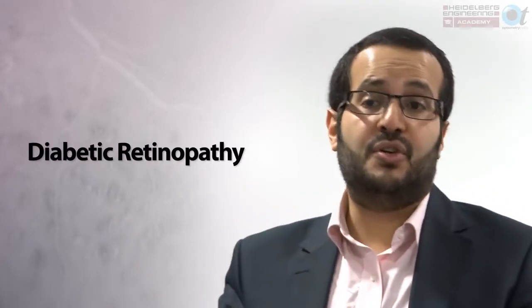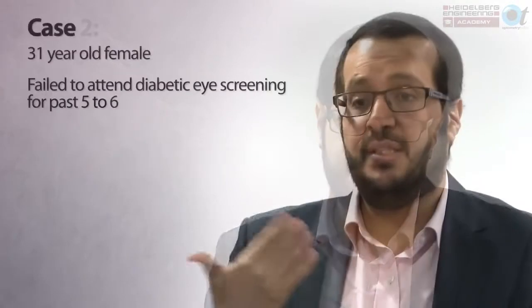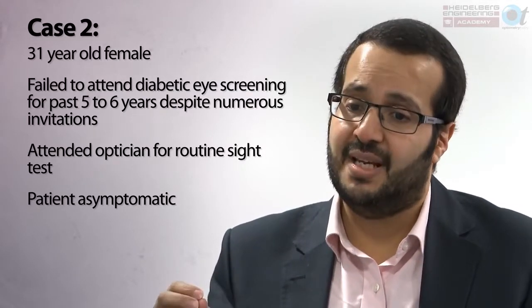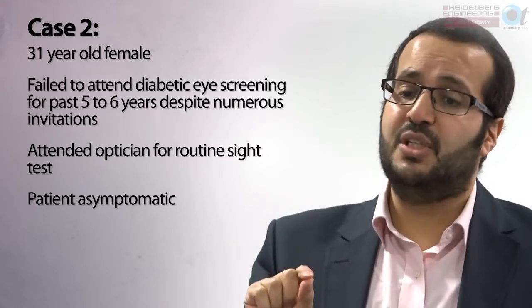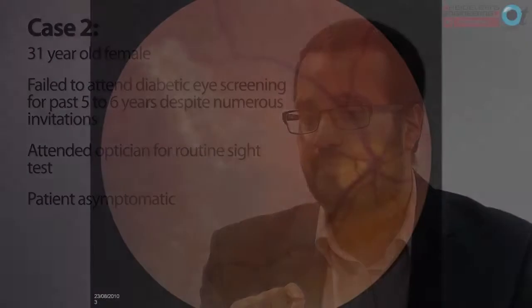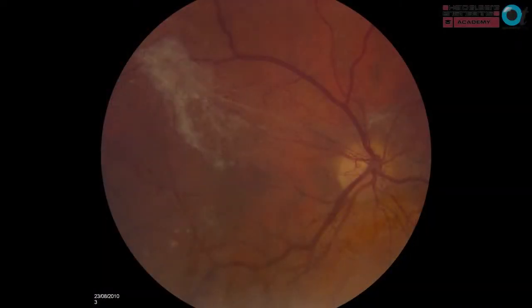And now I want to shift my focus to diabetic retinopathy. This is a 31-year-old female. She failed to attend the diabetic eye screening program for the past 5 to 6 years, despite numerous invitations. And she actually saw her optician for a routine sight test, and she was completely asymptomatic. But if you look, you've got significant diabetic retinopathy.